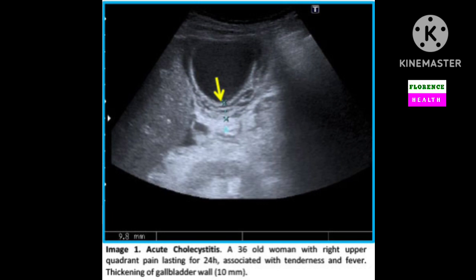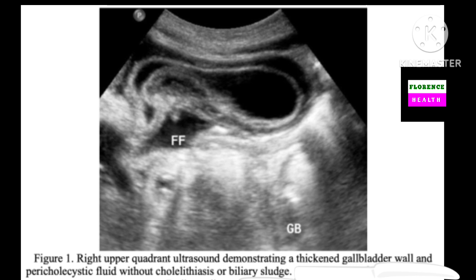Sandwich appearance of the gallbladder wall in transverse section. Slide with sandwich appearance of the gallbladder wall with fluid collection beyond the posterior wall.